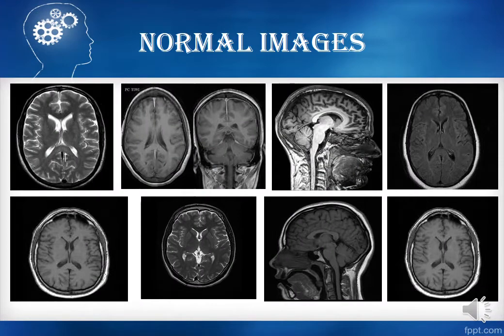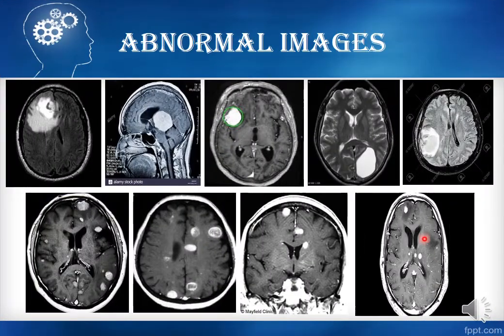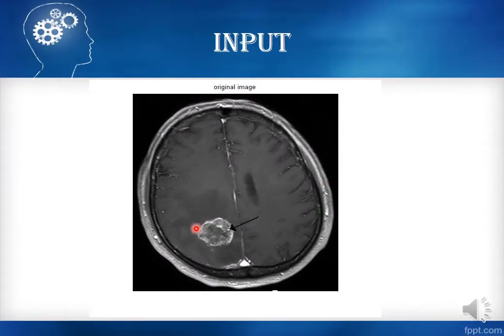Normal images, these are where there are no tumors. In most algorithms, while detecting the tumor, the algorithm also detects these as a tumor. This is a wrong perception, but this level set algorithm will detect only the tumor region. In this image, the foremost task is to detect this area of tumor region alone.